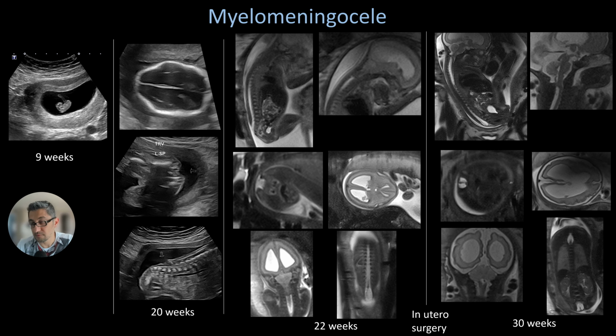The crowding of the neural elements at the level of the foramen magnum has significantly improved. On the previous MRI, the posterior fossa was too tiny, and you can't even differentiate the cerebellum, but on the follow-up MRI, we can see improvement of the size of the posterior fossa filled with CSF, and we can now visualize the cerebellum nicely.